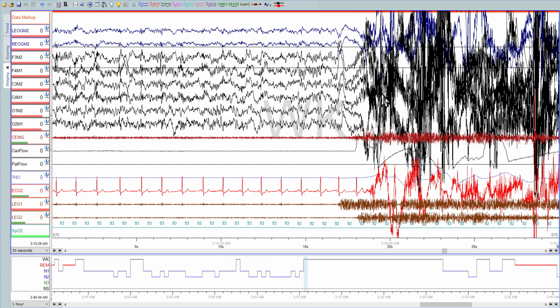Now you called this wake, but this is actually, the arousal starts here, so this wouldn't be wake. This would be two. Then wake, wake, wake, wake, wake, wake, and now we gotta read between the lines again.